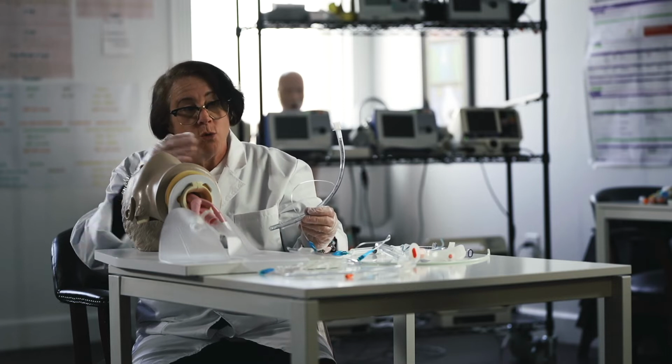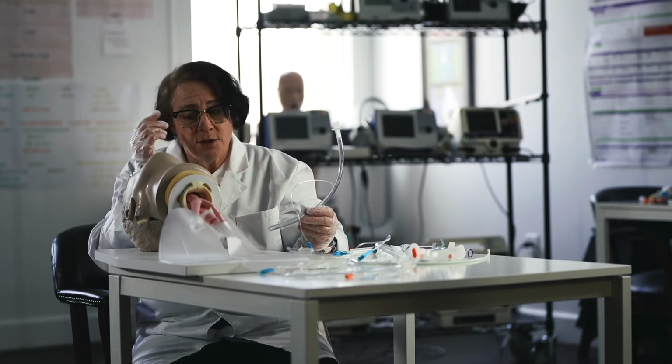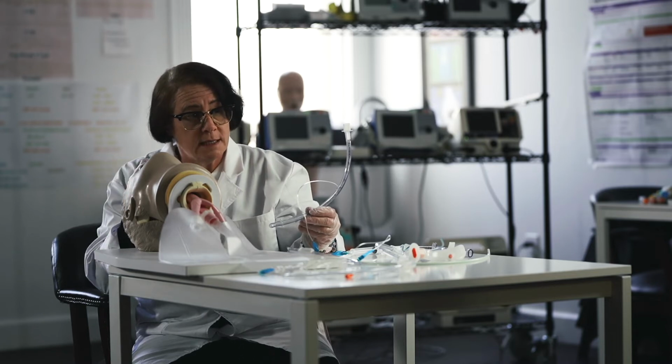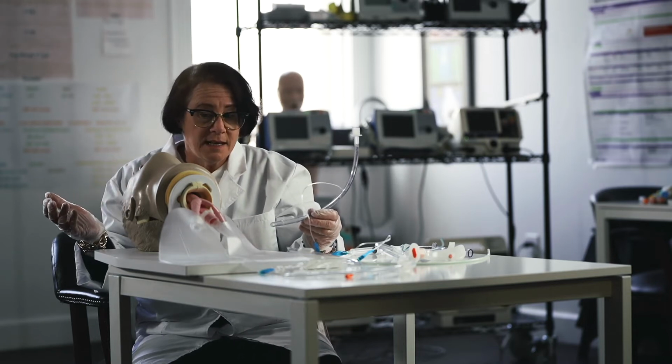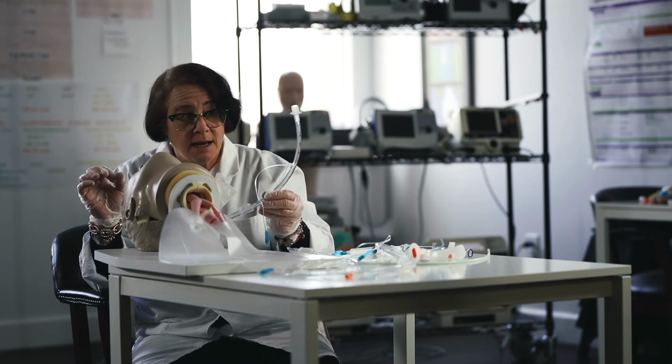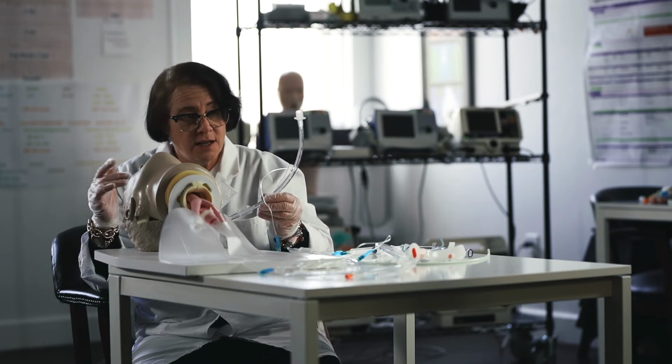Most of the patients will be orally intubated. Unless their mouth is needed for trauma or surgery, we typically orally intubate someone. If their mouth is necessary for one of those events, we would nasally intubate them. So we'll drop this down about half a size. Can you imagine that hose in your nose? I can't imagine it, honestly.